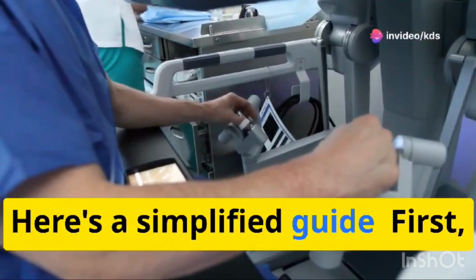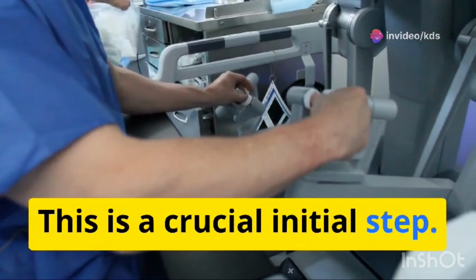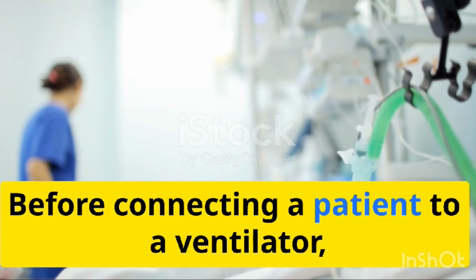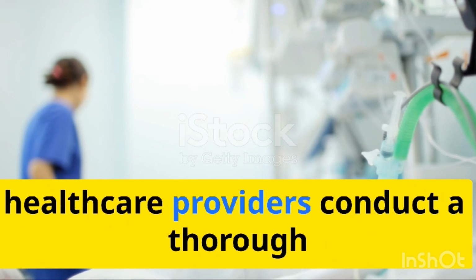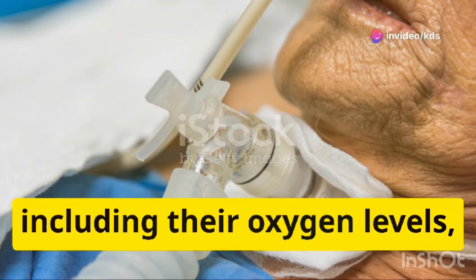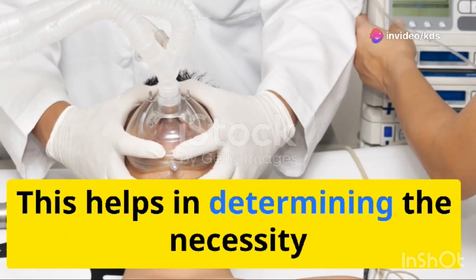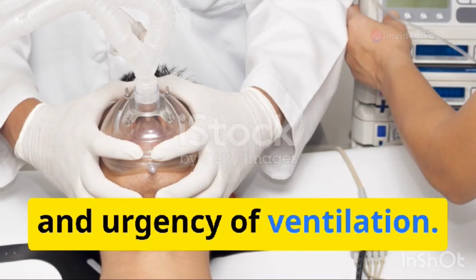Here's a simplified guide. First, patient assessment. This is a crucial initial step. Before connecting a patient to a ventilator, healthcare providers conduct a thorough assessment of their respiratory status, including their oxygen levels, breathing pattern, and overall condition. This helps in determining the necessity and urgency of ventilation.